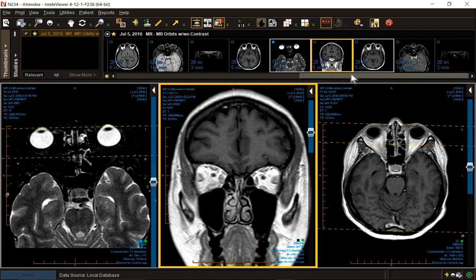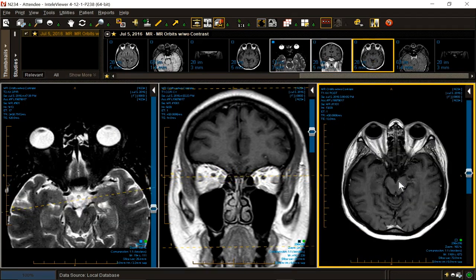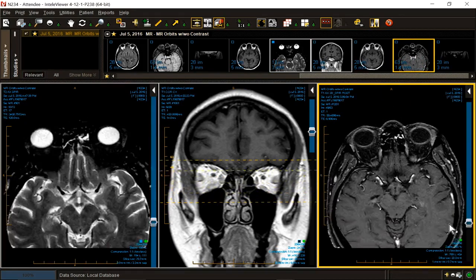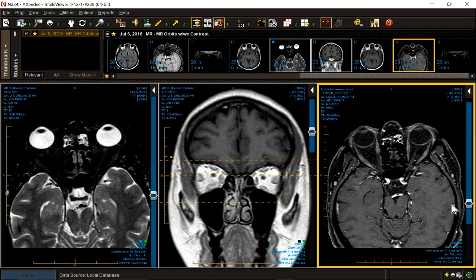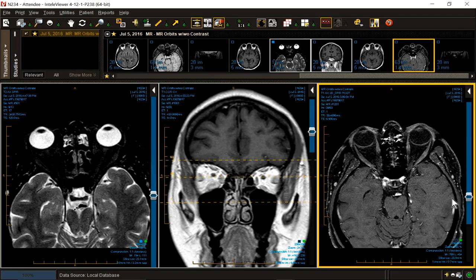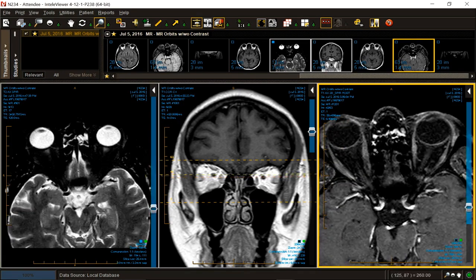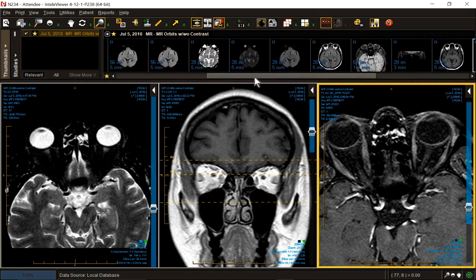Let's see if the muscle spindle ends are involved. No, they're nice and thin. They're nice and dark. They're nice and tapered. They are not involved. Let's get something with a little higher resolution. Contrast enhanced MR. Do we see some enhancing inflammatory pseudotumorous mass, a lymphomatous mass? No, we don't. But we do see delicate spindle ends of subtly enlarged muscles with hypertrophic fat and proptosis, which leads us to the correct diagnosis of thyroid ophthalmopathy.